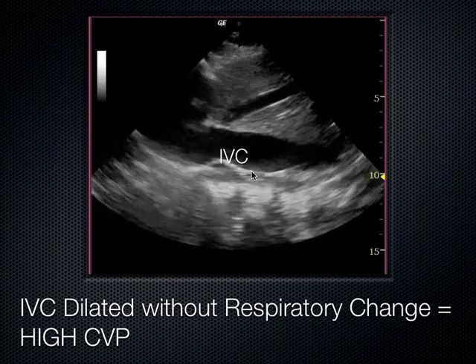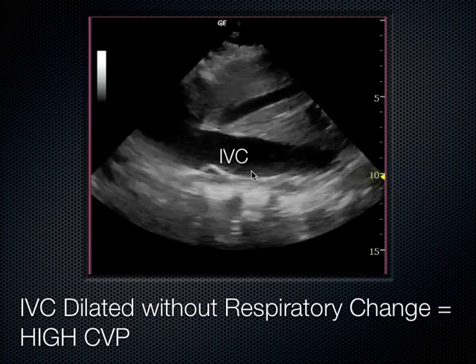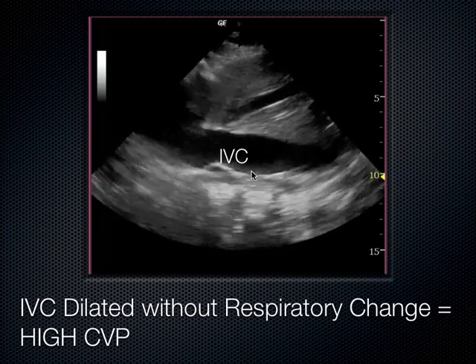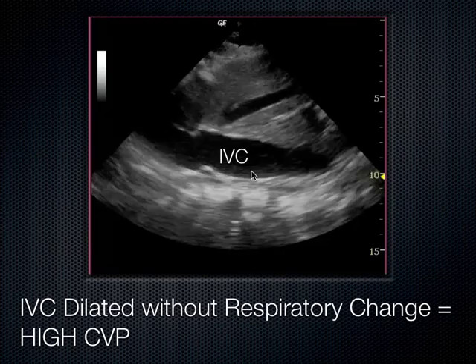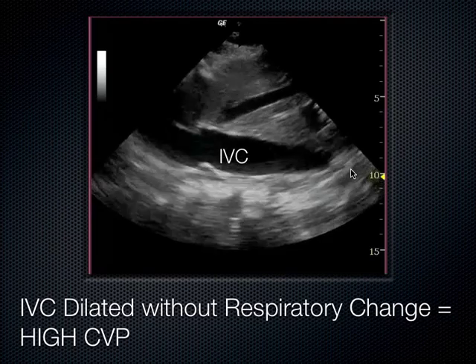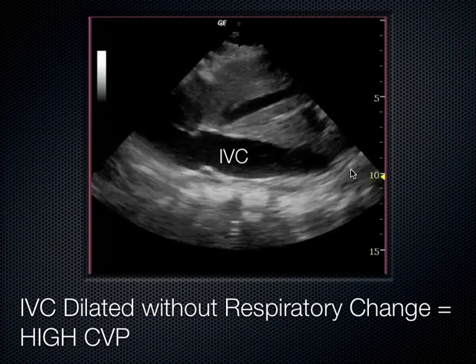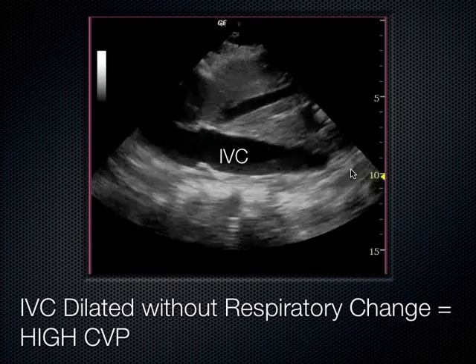I'm just throwing this out there. It's going to come up over and over and over again. I want you guys to be aware of it and how powerful that can be. Any questions about the IVC, CVP stuff? Okay. Yes? So when you float a filter, where is it going to land? The filter lands much more distal to this. Usually down lower, distally, not underneath the liver, but distally, typically.